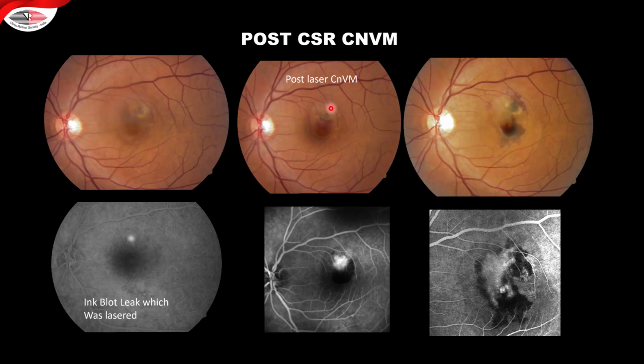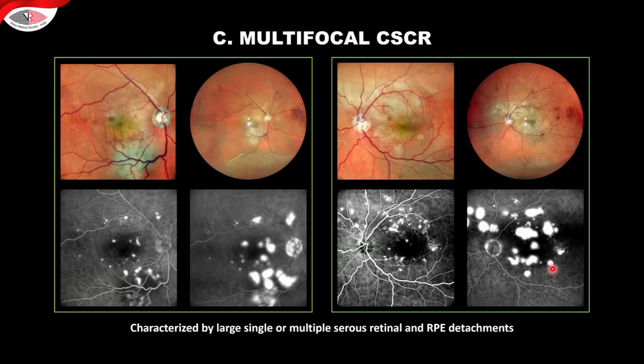So if you can see that this patient came back, we suggested giving anti-VEGFs, but the patient was reluctant and waited, and you can see how the SRNVM increased. And these are angiograms done over a period of time that you can confirm that this is a post-CSR CNVM forming and causing a lot of damage.